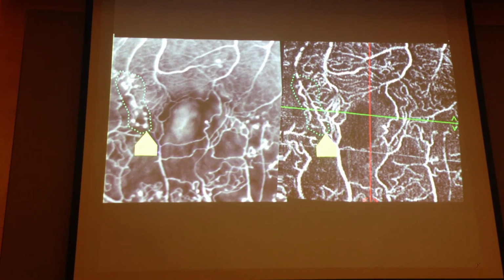And for automatic measurement done by any software, of course, with black and white, it's easier than in grayscale to identify all the non-perfused areas. So the angiography is very useful for that. It will help us to measure, and the software is already present. And you saw before from my colleague's previous presentations that OCTA is already able to measure. But remember that something can be missed.